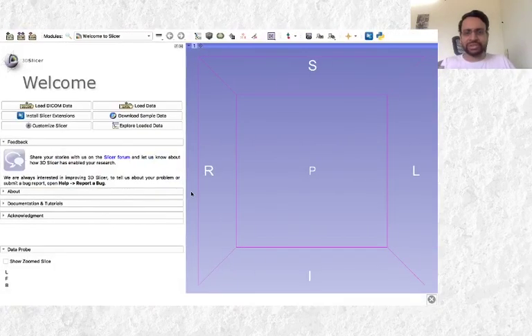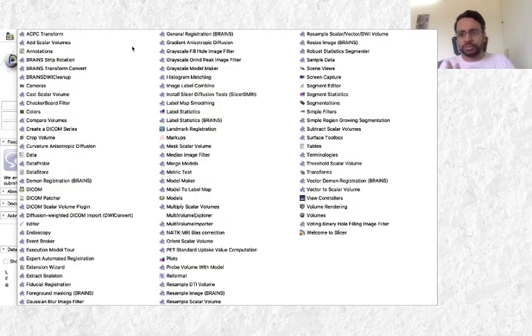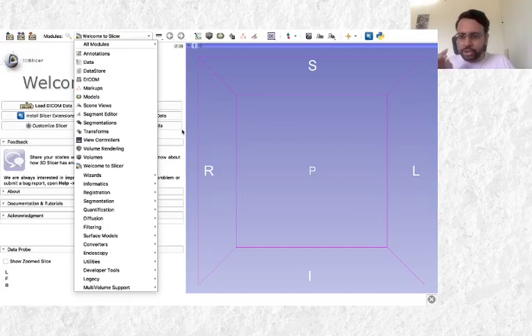I would call this tool a monster tool. It has so many features, so many existing algorithms that have been implemented here, so many modules here. Once you get used to it, you could do a lot of things with it. For example, look at how many types of algorithms there are which you could use from this GUI. To name a few, I could actually come back here. Let me show you some widely used ones already present here.